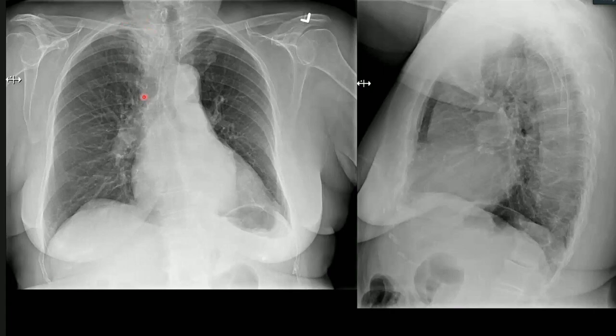To me, I was thinking of this radiopacity, which is reaching up to the lung apex. But when I looked back, how are you able to explain it? If the cervicothoracic sign is positive, what do you mean?